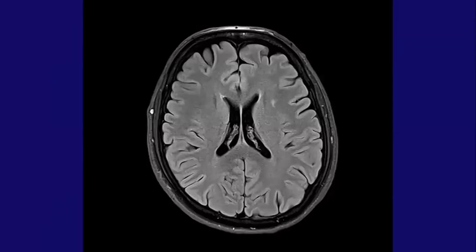You can see that the white matter is relatively darker compared to the gray matter. The gray matter is surrounding the white matter, but fluid is still appearing dark. And here is what we call the FLAIR sequence. I hope that makes sense, but we'll have a discussion with questions. Next, please.